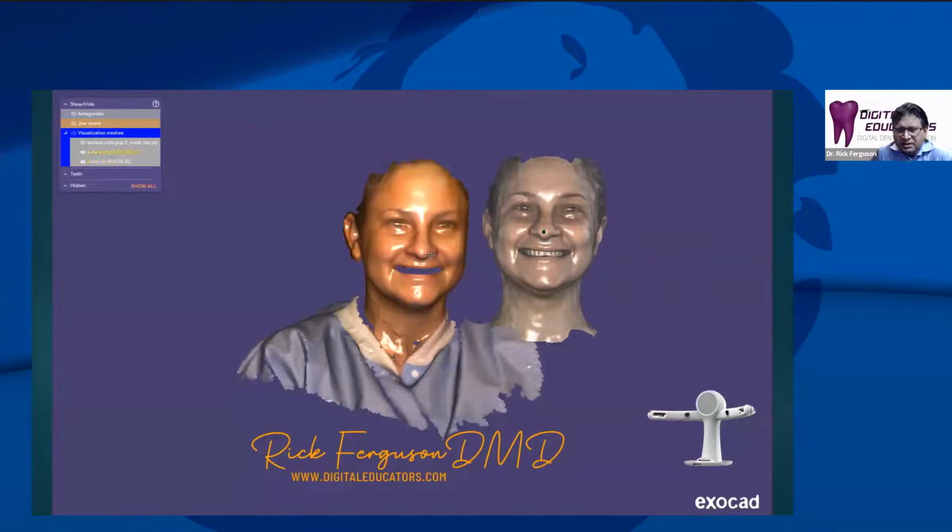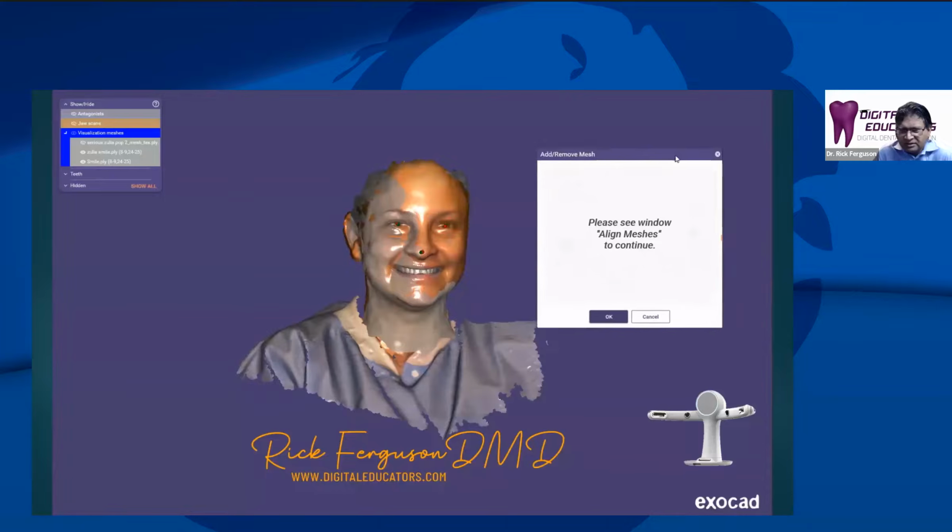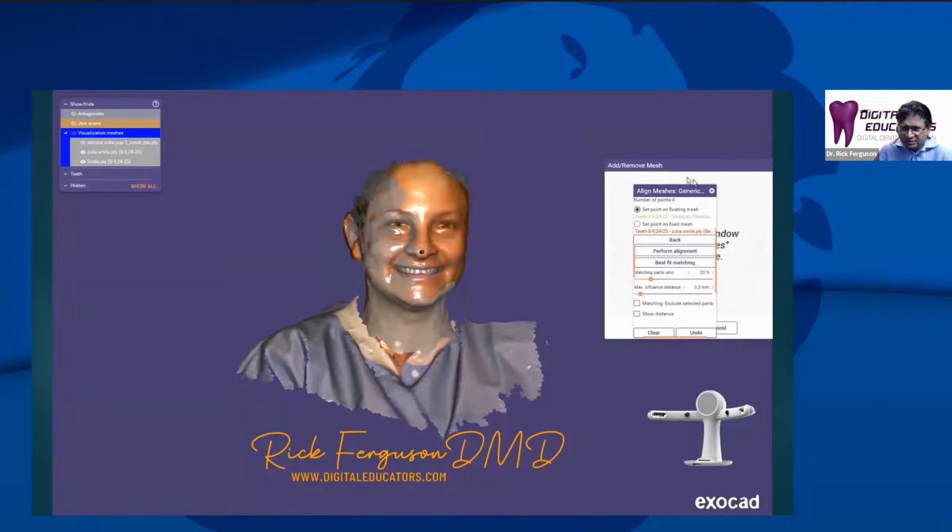So what you see here is the brightly colored image is from the Einstar. And what we have on the other image to the right-hand side is from the Ray scan, the Ray face scanner. So you have a $1,000 scanner and a $20,000 scanner. And what I'm doing here is using Exocad because they have really good best fit matching functionality. So we can compare the two images. So we're using the best fit matching functionality to see how accurate these are compared to each other.